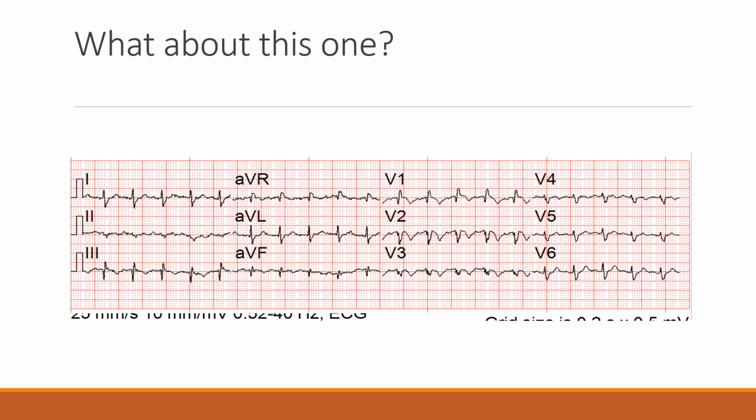And so I think most of us, we see tachycardia, we see it's sinus in nature, so we have sinus tachycardia. And if you're not trained to look at this stuff, you might go, sinus tachycardia, looks like maybe I have a right bundle branch block there if I use the old blinker method. By the way, I also hate that, so don't do the blinker method either. The blinker method actually isn't 100% right, so it'll lead you astray. And again, we can do better than the blinker method.